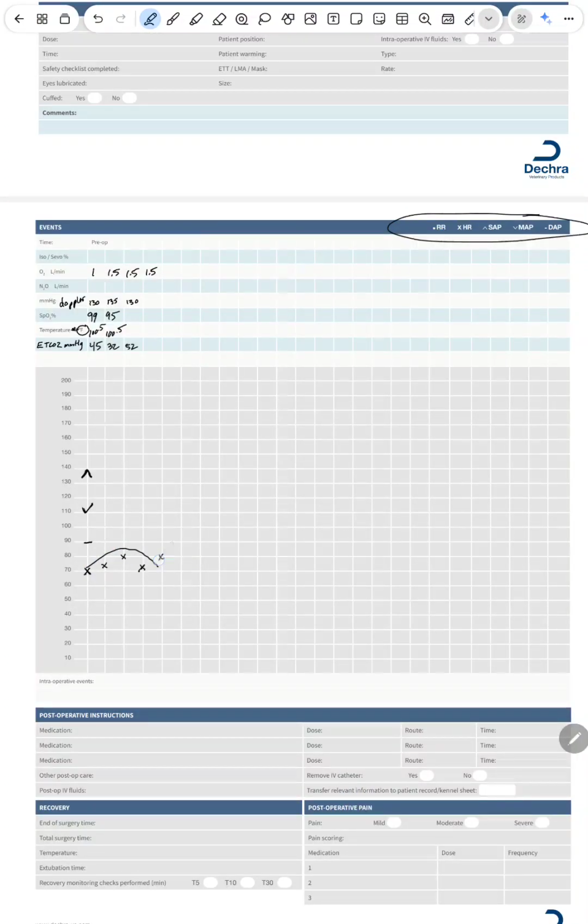We're watching this heart rate all of a sudden spike, and we go, ooh, what does that mean? Does that mean there was pain? Does that mean I was trying to wake him up? I stopped anesthesia. He woke up and his heart rate went shabam. Whatever it's doing, it can tell us a story. And then respiratory rate for this one, it's a solid circle. Solid circle. So a little bit different than the other sheets we have seen.